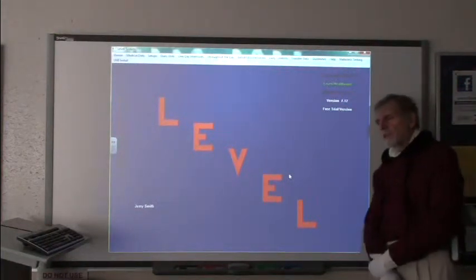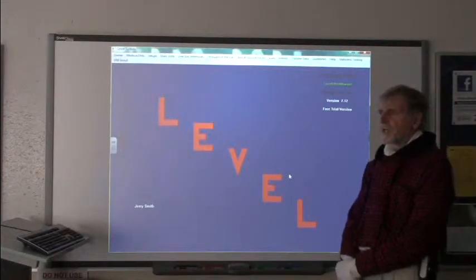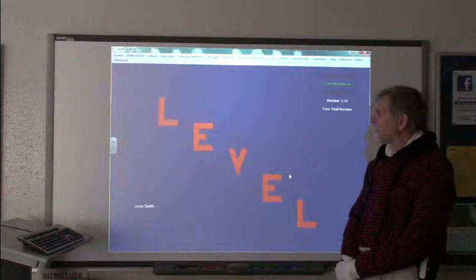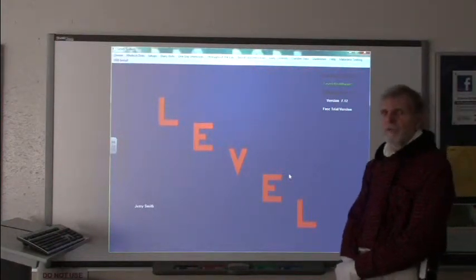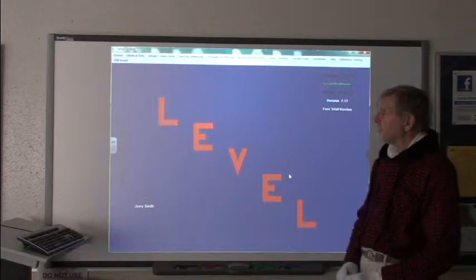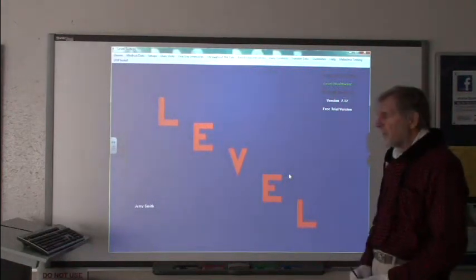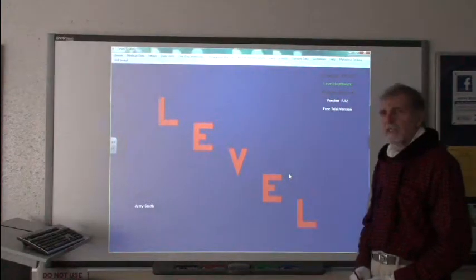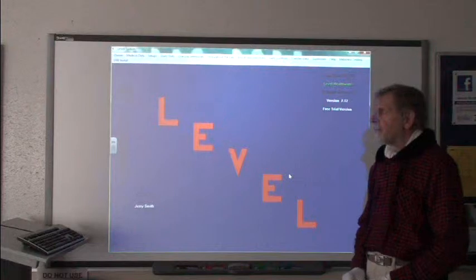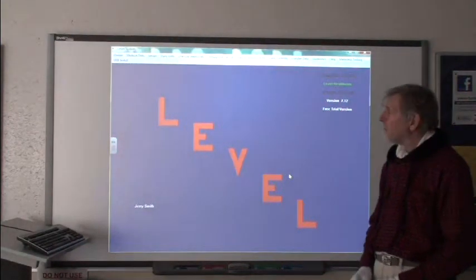You might want to do this sometimes if you find that the check-in and check-out times of around 30 seconds are becoming obnoxiously long, and you just want to work offline for a while. So all you do is disconnect, work offline, and then when you're ready to reconnect, you reconnect, and you choose the data set in this computer to be your beginning data set. It's moved into the internet data storage location, and it's just like you never left it at all.